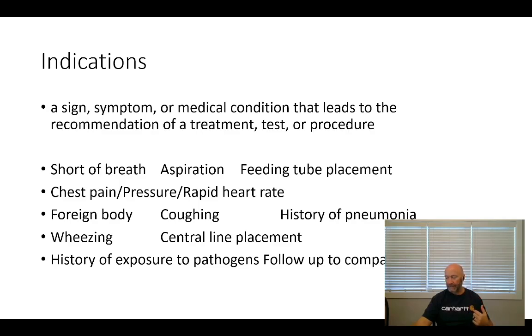What that is, is kind of like a really, really good IV. So what they're going to do is put this IV sometimes into the patient's jugular vein, and sometimes in the subclavian vein. And what they want to see is it going down into the superior vena cava, possibly into the right atrium. So you want to see it going down. Sometimes it makes a turn, especially if it's in the subclavian, and it might go up instead of down. So it may go into the internal or external jugular instead of into the vena cava. So it may be placement of a chest tube.